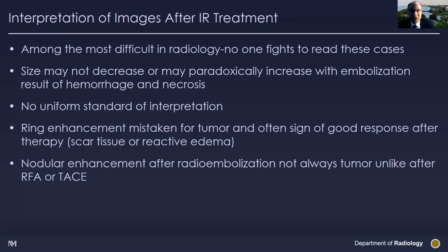And the reason that these are challenging is because the size may not decrease, or you may paradoxically see an increase in size following embolization. And this is felt to be due to hemorrhage and necrosis. In addition, it's important to recognize that there's really no uniform standard of interpretation, as I'll talk about. In addition, ring enhancement can be mistaken for tumor, and it's actually often a good sign of a good response after therapy, and it's felt probably due to scar tissue or reactive edema.